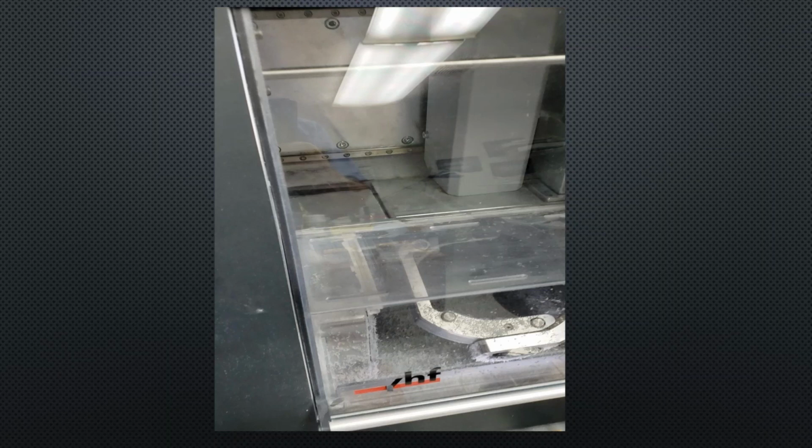And you can do little things. You can use popsicle sticks. You can use, like I said, these little old ball clasps, whatever, to support things as it goes through that milling.